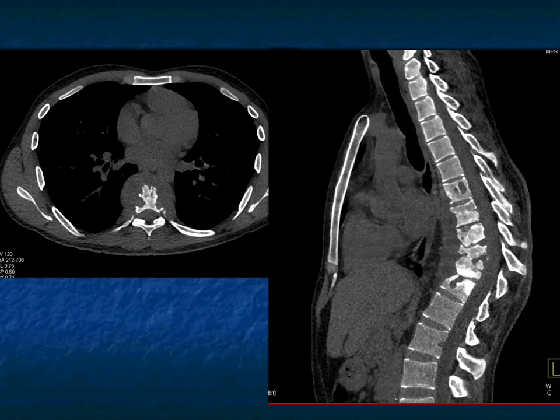When you have bone involvement and you look at the sagittal views, things become clearer, because what you see is there are multiple vertebral bodies with a gibbous-type deformity, and the vertebral bodies are destroyed. Now, you can get infiltration by lymphoma. You can get infiltration by neurogenic tumors like neurofibromatosis. But when you have the destruction of bone, it really is focusing on an inflammatory process, and the angulation makes you think about Pott's disease, which is classic basically for tuberculosis.